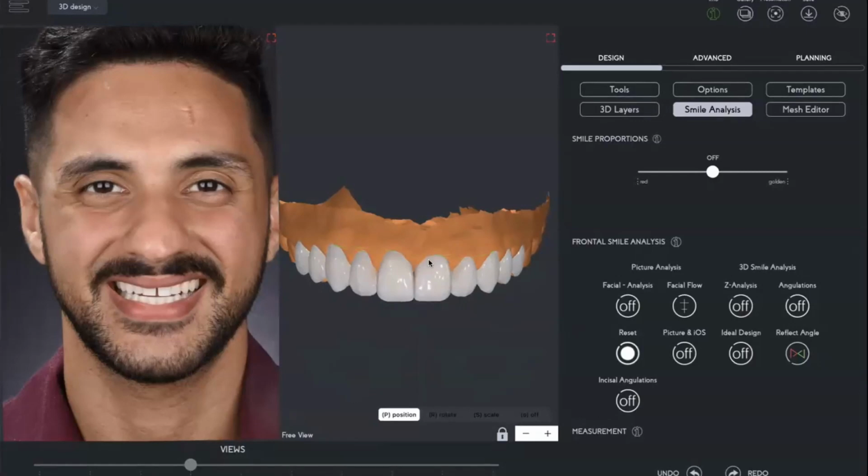And also we see that the gingival margins for the centrals are not the same. And that's something that disturbs me, because what you see in a smile is always the centrals, and the centrals need to be the same size, gingival margins, round, symmetric, beautiful, because that's gonna be the first thing that you see in a smile. And we have here a completely different gingival margin form than on this other side. So we need to correct that. Patient has a beautiful visualization of what can be done, and then we can discuss the treatment.